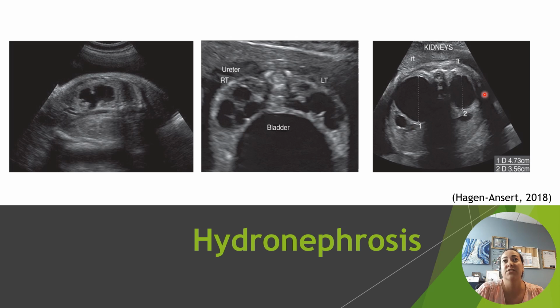And then here's another example of what that can look like differently, where we have really large renal obstruction and hydronephrosis demonstrated here. When it gets to be like this, it's going to be more concerning in how that renal function is going to be. That renal tissue is getting really pushed out and stretched, and that can impact renal function.